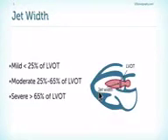Let's take a look at another way of quantifying aortic regurgitation with the help of the jet. Well, we can look at the width of the jet and compare it to the LVOT. If it is below 25% of the LVOT, then we can consider regurgitation to be mild. If it's between 25 and 65% of the LVOT, it's moderate. And if it's above 65%, it's usually severe.